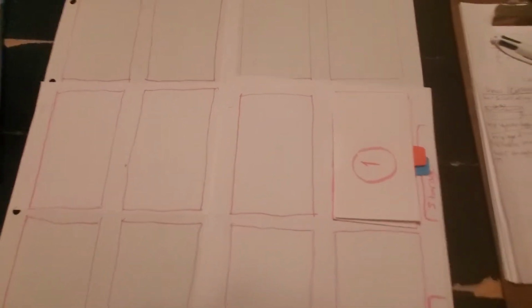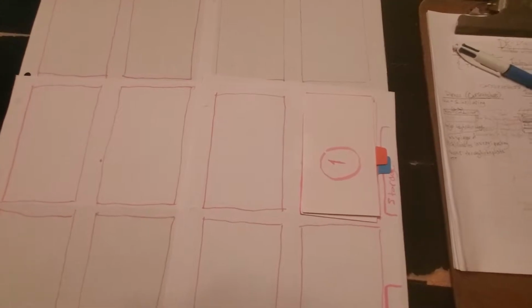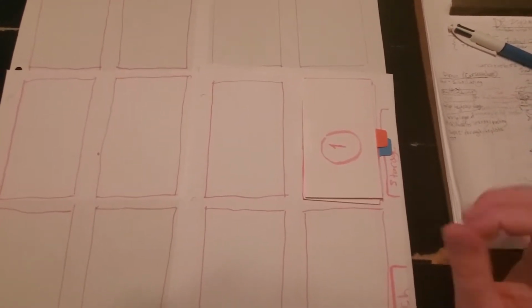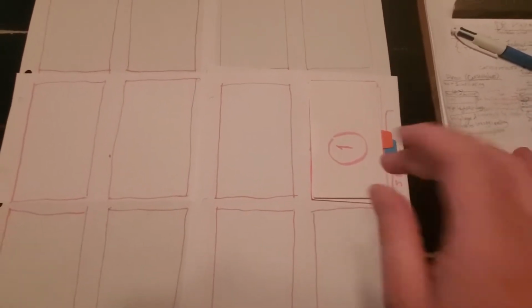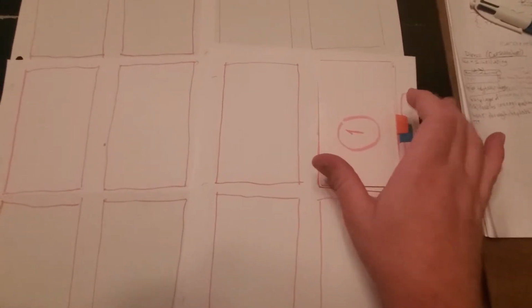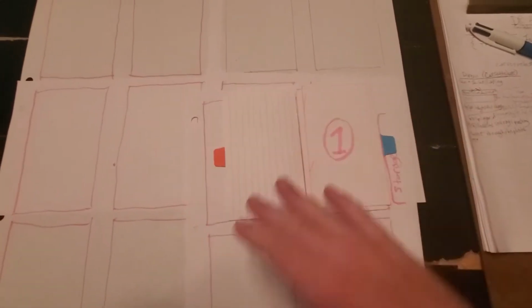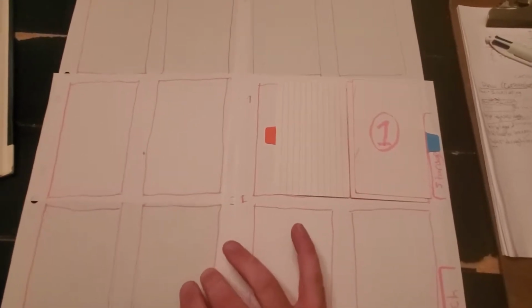So the photodiode has changed a photon that it received from the scintillator layer. It's brought down a negative charge on this pixel element, picture element, pixel. Actually, it's not a negative charge, it's actually a 1.